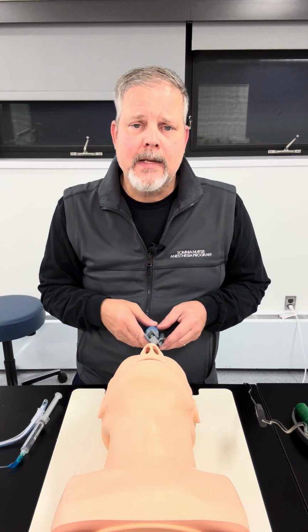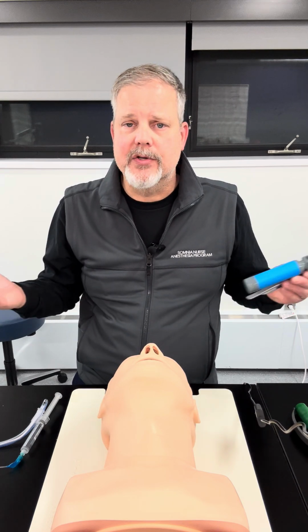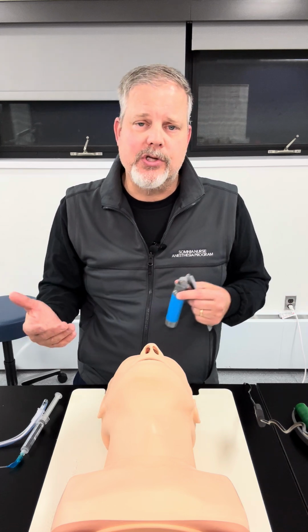As we talk about establishing the airway, we need to remember that there are a couple of different tools that you need to have readily available. The first one I want to talk about is your blade, or your laryngoscope. There are a couple of different types that you can use, but I'm going to talk about two of the basics today. I like the Miller 2. That's my blade of choice. I've used it for a number of years. I'll talk about the Miller 2, and I'll talk about a Mac 3 and tell you a little bit of the difference.